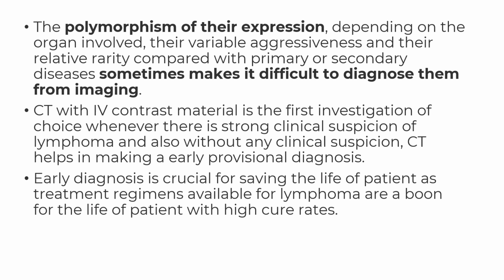CT with IV contrast material is the first investigation of choice whenever there is strong clinical suspicion of lymphoma. And also, without any clinical suspicion, CT helps in making an early provisional diagnosis. Early diagnosis is crucial for saving the life of the patient, as treatment regimens available for lymphoma are a boon for the life of the patient, with high cure rates.